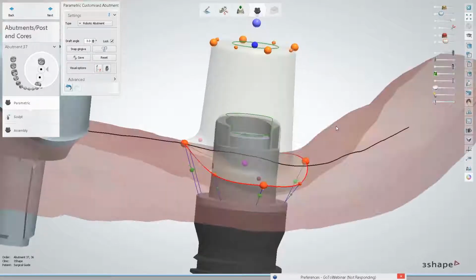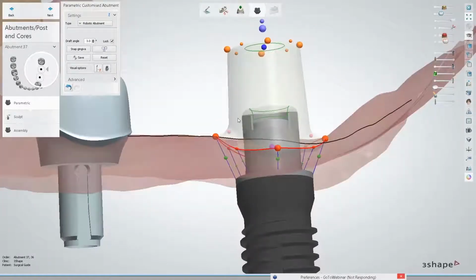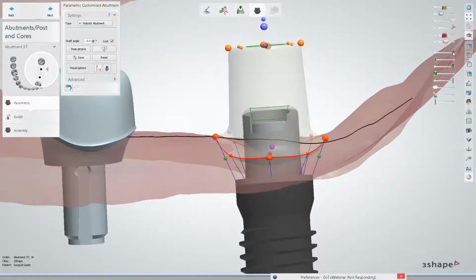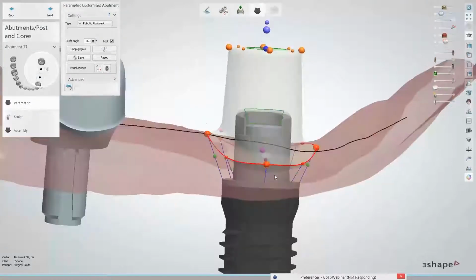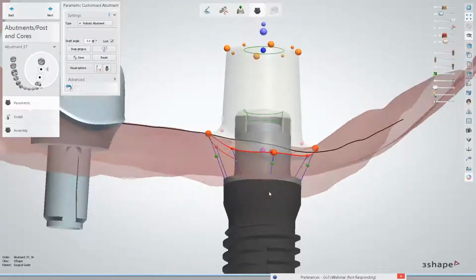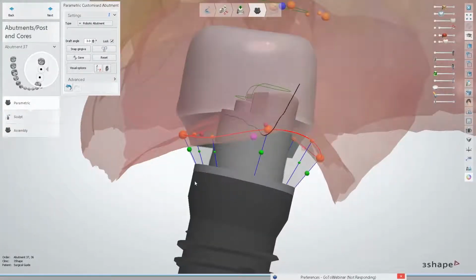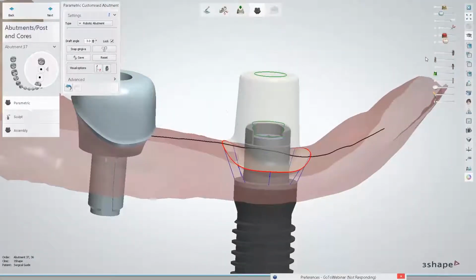And that's why I would say that it should be easier to make this kind of setup, and of course most of the cases will be allowed for local manufacturing, but only for really deep placement of the implant, as we need to take under consideration not only the height of the stump for the titanium interface, but also the inner part of it.